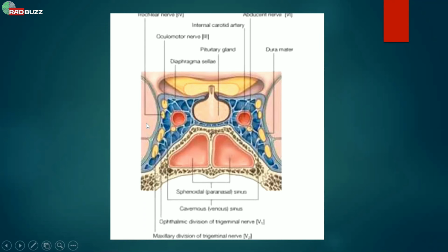These structures are important because patients usually present with cranial nerve palsy symptoms, or in cases of cavernous sinus thrombosis, there are different sinus symptoms. If the carotid artery is involved, its lumen is involved. There will be lack of flow void on MR, and you can't see enhancement of it. Aneurysms of the carotid artery can cause mass effect and optic chiasm pathologies.